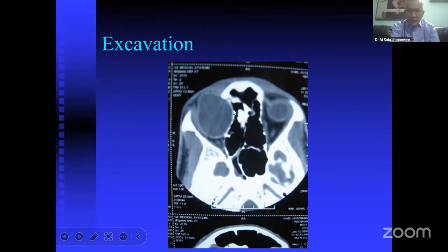And what has happened to the medial wall? The medial wall has given way, it's not broken, it's excavated, and a smooth curvature is there. And where is the level? These walls are not parallel. And here you see the reflected tendon of the superior oblique. So it is an upper level cut.